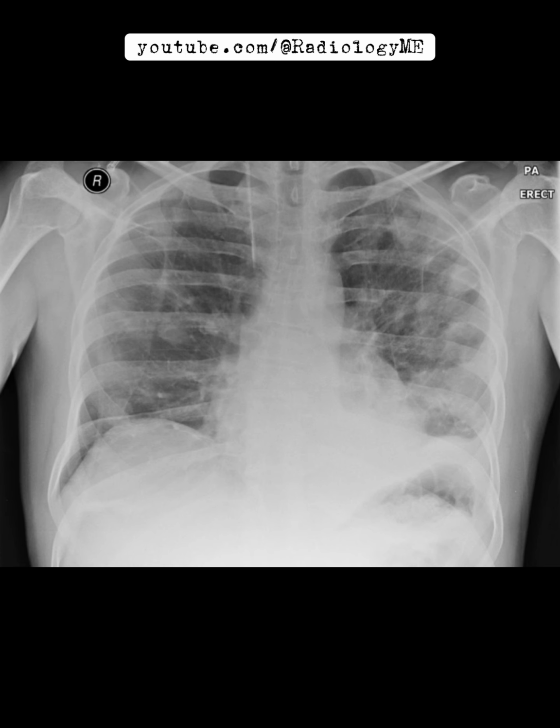All right, let's walk through this case involving a 23-year-old male with an acute onset of shortness of breath and haemoptysis, guided by the images provided. First off, what we're looking at is a chest radiograph and axial CT images of the chest, which show some interesting findings. So starting with the chest radiograph, the most prominent feature here is the presence of multiple small nodular opacities in both lungs, but they're especially concentrated in the periphery of the left lung.